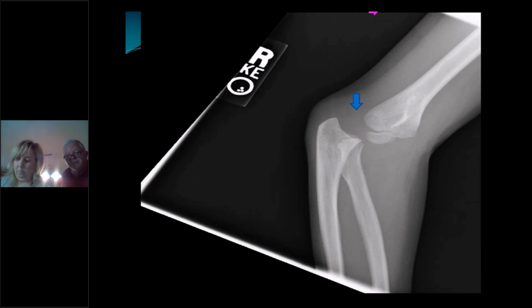It's a dislocated elbow. These are pretty tough, especially in kids or adults, doesn't really matter. Before trying to reduce these, you better make sure you have some backup, because if you do reduce it and the ulnar nerve gets entrapped, then you go to the OR right away to get that released. I have not ever had that happen with an elbow that I have done. I will tell you, this is not a nursemaid's elbow.